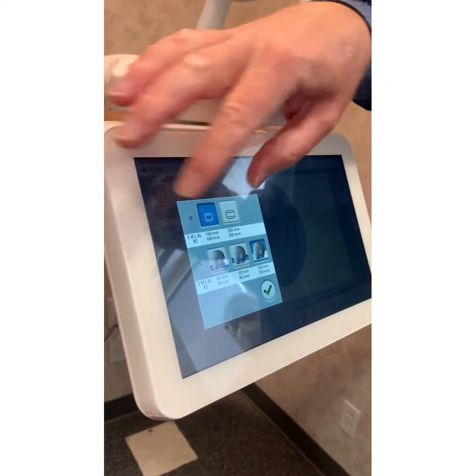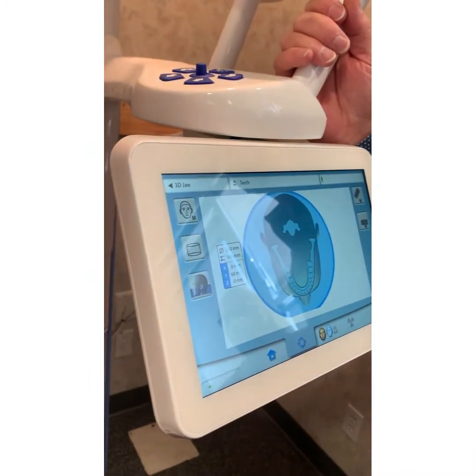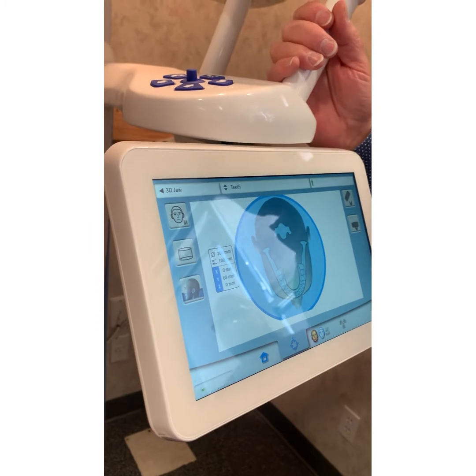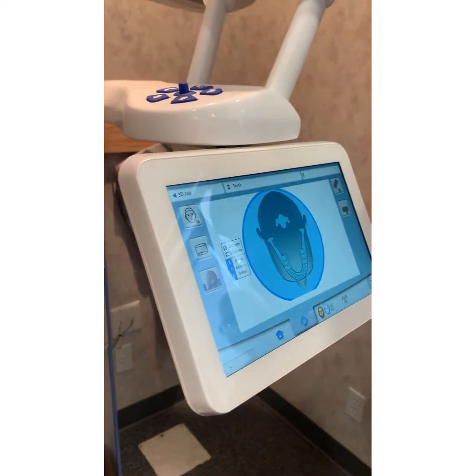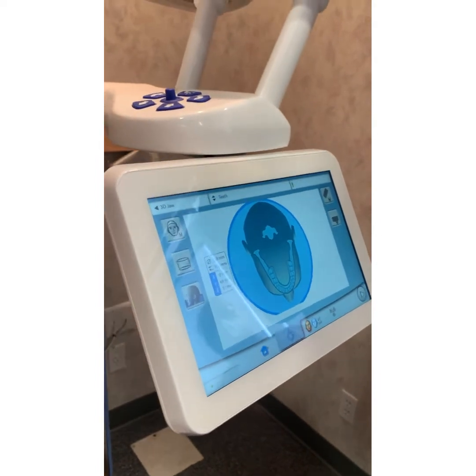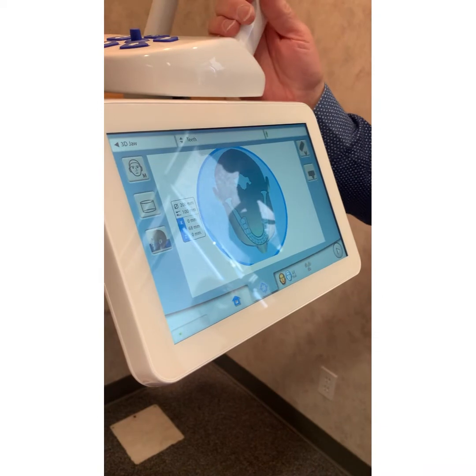Let's say somebody came with a broken jaw from a fight at a bar, and they can't open their mouth, and I could tell. I've seen people with broken jaws way back here. So for more like the TMJ joint, you're getting both condyles and 20 centimeters in this direction. That's the whole bucket. So it'll allow you to get everything.